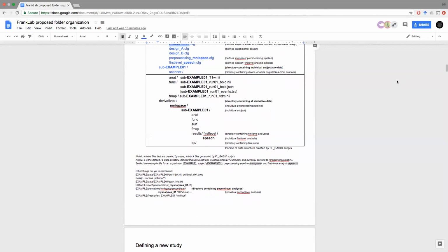Yeah, exactly. So the difference between the T1 and brain is whether you have the skull or not. So T1 typically has the skull, and brain doesn't have the skull. And in practice, I find that it typically works better when you do have the skull. So I like the T1 better, but I haven't seen that dramatic of a difference in either case, because the skull is typically not very visible in the functional data either way. So when you do co-registration, it doesn't matter too much whether you have the skull or not.